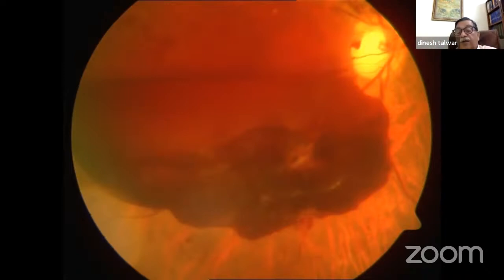But the only place where the doubt of subretinal hemorrhage comes, let's assume it was this dense but subretinal. Then you would see the vessel in front of it, even darker than this. Because you don't see that, and because it is red. If it was subretinal, it is beneath the retina and has a little more grayish tinge to it. So that also gives you a clue that this is part of the same pre-retinal hemorrhage.